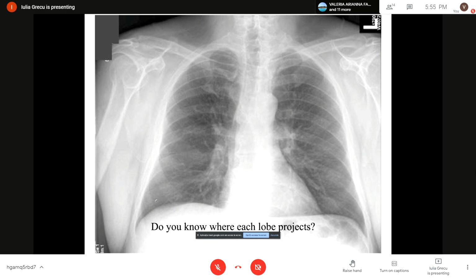Okay. After we studied the trachea and bronchi, we studied the pulmonary hilum, and then we go a little bit further and study the normal aspect of the lungs, the normal lucency, on which we find superimposed these vascular markings and this small linear opacity, which represents the interstitial aspect of the lungs.